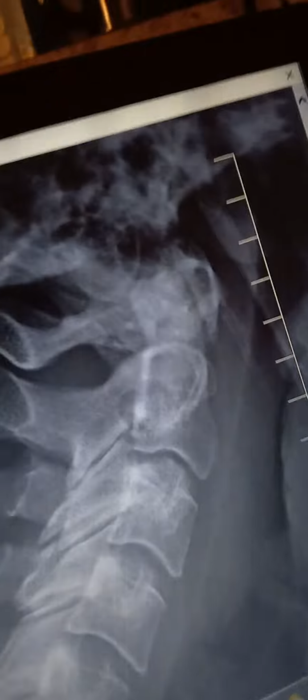And see, I don't know if I was attacked or not, but if I was, they might have a Jones for me by now. They're trying to hide. They tried to kill me, and I'm seeing the evidence, and you won't. That ain't even a millimeter from one another. And it looks like it was collapsed again. It's way closer than it should be. Even the skull looks compressed upon the C1.